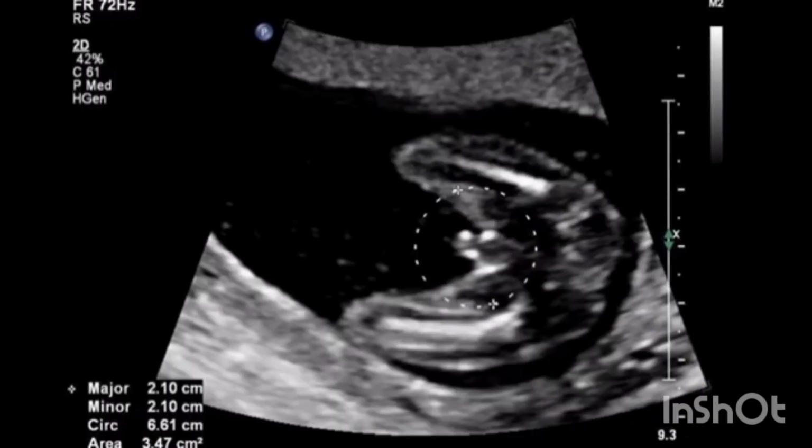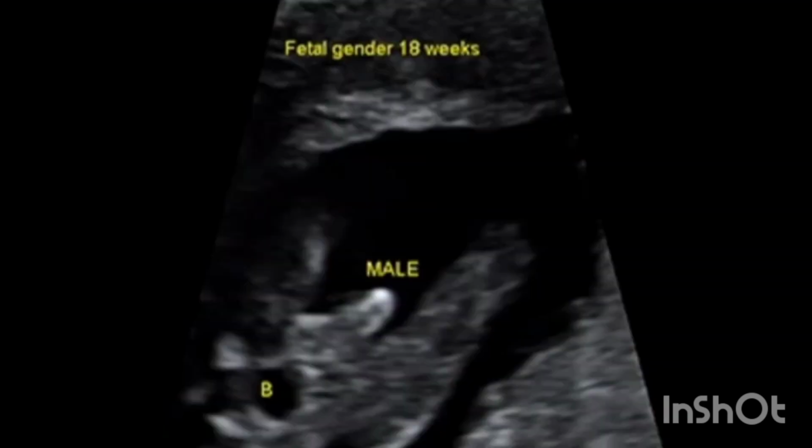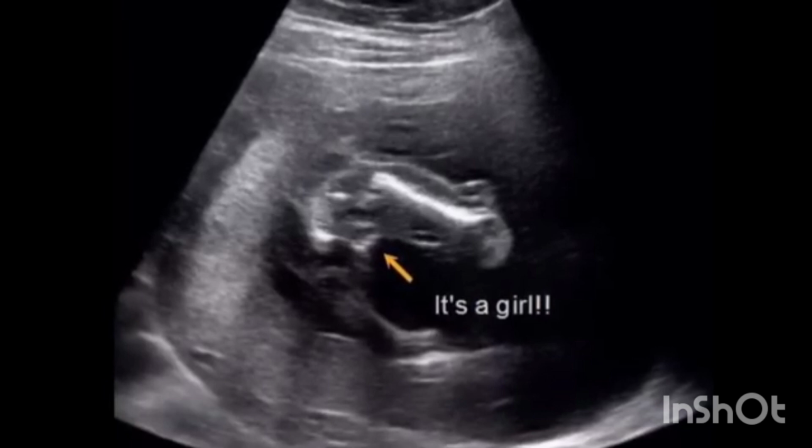Trick 3. Note the presence or absence of a penis at 18 to 20 weeks. Once you reach the 18 to 20 week ultrasound, it should be a lot easier to predict gender. The easiest way is to look for a penis. If you see one, there's an excellent chance the gender is male. The absence of a penis indicates female.